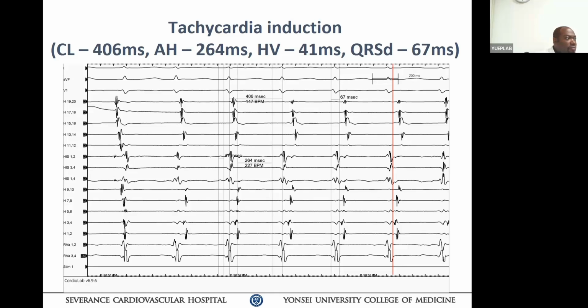But how come in the CS the two tachycardia cycles are similar? Is it a coincidence, or did one tachycardia provoke the other? I cannot prove that. We have not mapped the collision wavefront or any of that. But I assume that two tachycardias are going on, because you look at the degree of fusion. Look at the HRA signal: the first one, the second or third one, and then the last bit goes back to the atrial tachycardia again. Because the degree of fusion varies, I think it's a double tachycardia going on at the same time. What mechanism, I don't know.